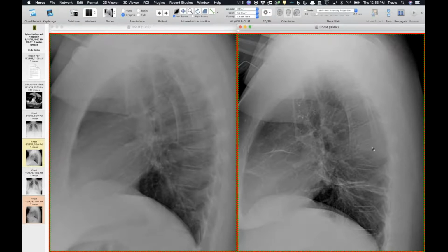Yeah, so it's a lot more obvious on the lateral view. It's still pretty subtle, but you can see there's a new vertebral plana or near vertebral plana at this level. As you see end plate, and then kind of an end plate right here, and this vertebral body that's just squished. Because you can see that there's the posterior aspects of the ribs here.